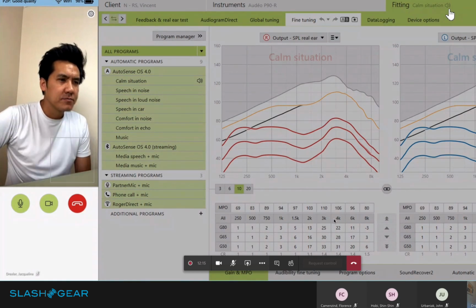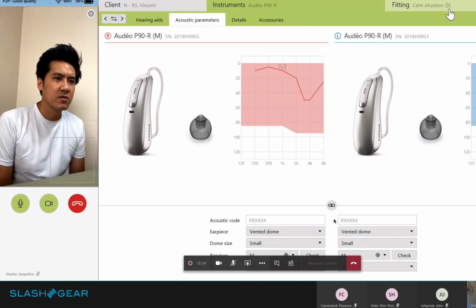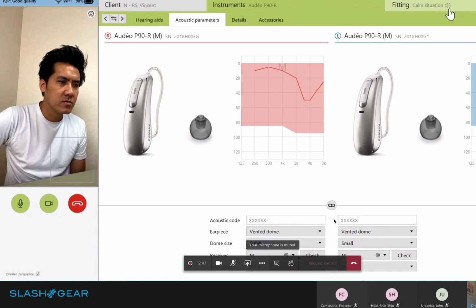On the app, it shows, and this is a future improvement we'd like to make, from your perspective that as soon as I start connecting your hearing aid to the software, you're already connected. But for the hearing care professional, it takes a little bit longer to pull in all that data from the hearing aids. So there's this mismatch in the status, and that's something we are aware of and want to improve, this transparency aspect. Okay, so now you're officially connected.